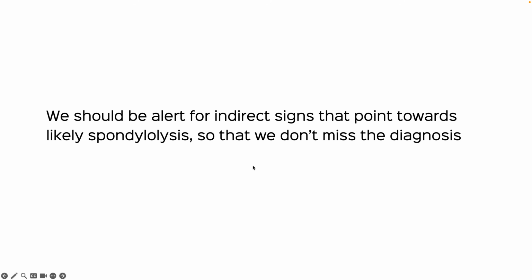So, in summary, we should be alert for indirect signs that point towards likely spondylolysis, so we don't miss the diagnosis.